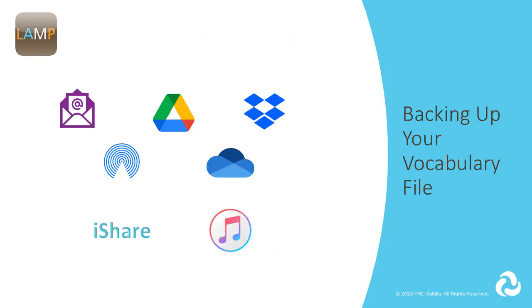When you have finished customizing the vocabulary file in your LAMP Words for Life app, you will want to make sure you have saved a copy somewhere. There are many ways to back up your custom vocabulary files and transfer them to your preferred storage space. Refer to the Backup and Transfer Quick Reference Guide for more information about each of these options.